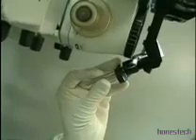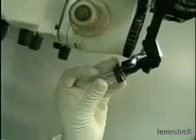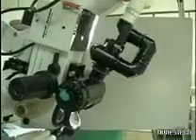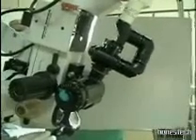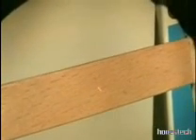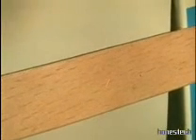If the operating microscope is used, a joystick-controlled electrical motor can rotate the linear beam with an angular movement on the work area by guiding the flash scanner connected between the laser arm and the operating microscope. The width of the line squares with the diameter of the beam traveling along the line, i.e. 250 microns for a focal length of 400 millimeters.